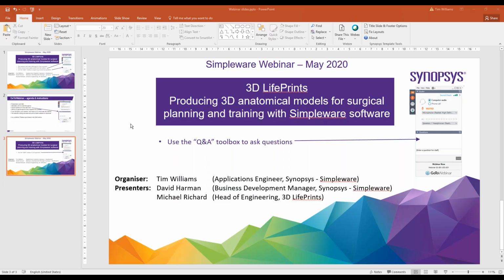Yeah, so I can expand on that one as well. Essentially, yes, we have tools for both automatic or landmark-based registration processes, so that you can then have the registered data sets in the same location, and then you could use the CT for maybe the bones or the vasculature, and the MR for the tumor or the soft tissues. So yes, that's definitely something that can be done.